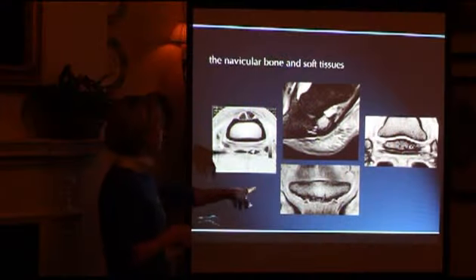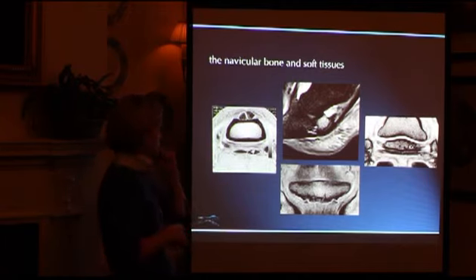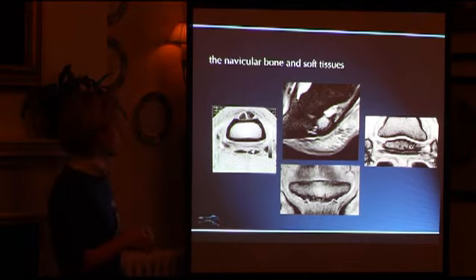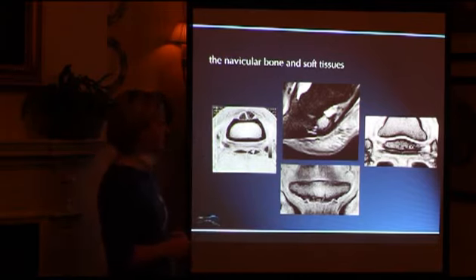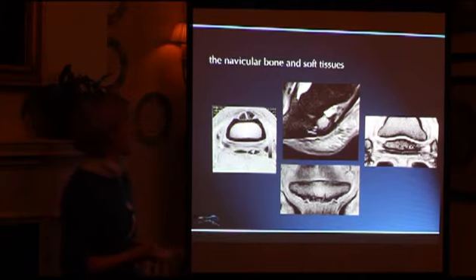We do know that that appearance, as I said, isn't necessarily the answer in itself. That can be indicative of other things going on in the navicular bone that we need to know about. But again, the system is excellent at finding abnormal areas of fluid or other substances in bone. I've mentioned the distal border. The distal border of the navicular bone can be much more easily interpreted using MRI, and the ligamentous attachments that are involved with the distal border, we'll talk about those a little bit later. And again, on the right hand side there, fluid accumulation or early degenerative damage of the flexor cortex.